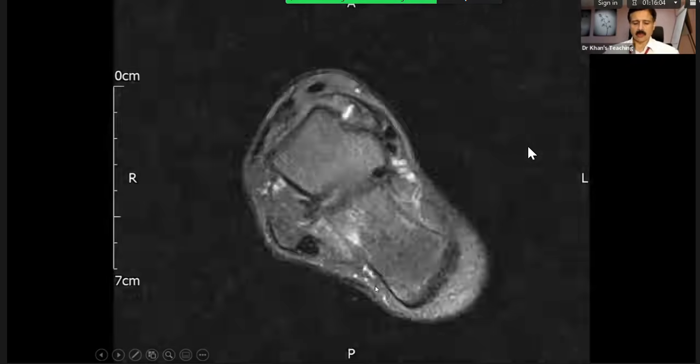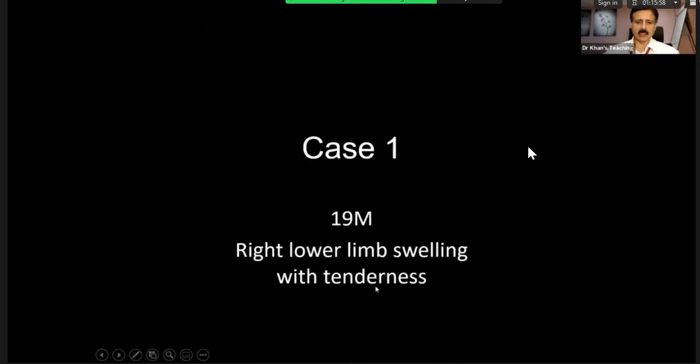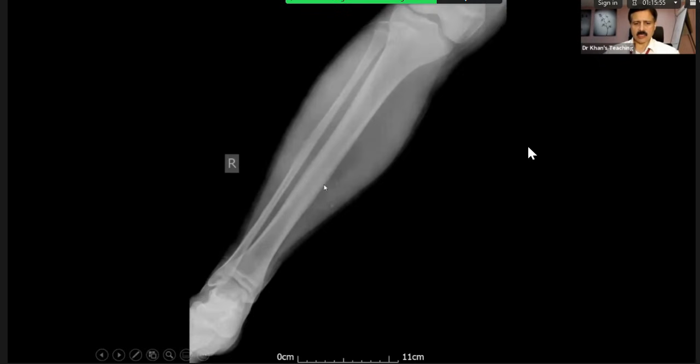Right. Okay, well done. So the point is, this is an exam case, and the key thing here is that there is an aggressive lesion, and then we saw on MR that it had to be aggressive because whatever the lesion is, it was invading the bone. Key thing is these phleboliths. So this is what we call an intramuscular hemangioma. Of course, you are right. These days, the classification is different. And there is a concept of venous malformation, veno-lymphatic. There's a bit of classification according to which component is dominant.